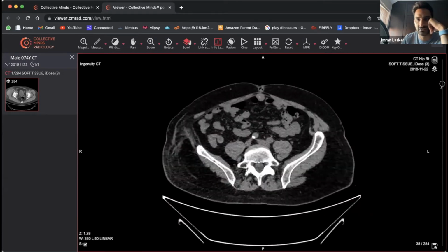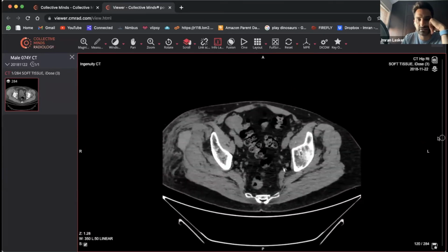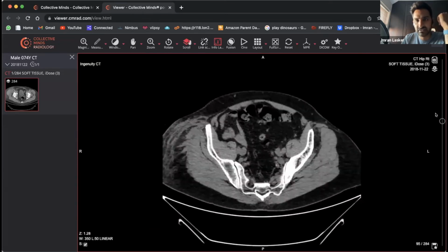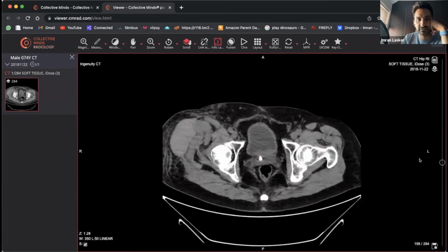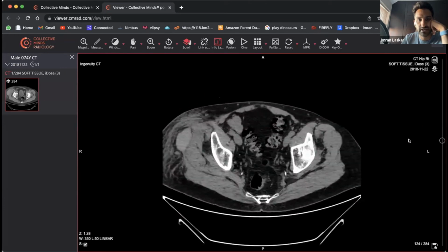abdominal window. So then you've got to make sure, okay, this patient's got abdominal pain. Let's go through the bowels. Bowel looks okay so far. I can't see any hernia or anything like that. Everything looks okay. As much of the bowel as we've got, we can see looks all right. Right iliac fossa looks okay as well. Yeah, not really much going on, but some of you may have spotted that there is some fat stranding located within the subcutaneous tissues over here and over here.